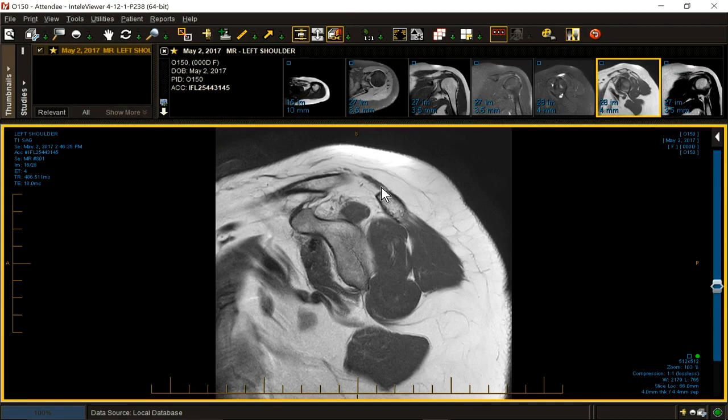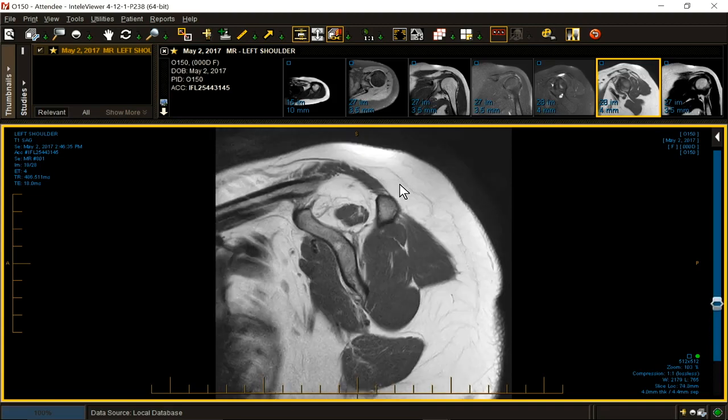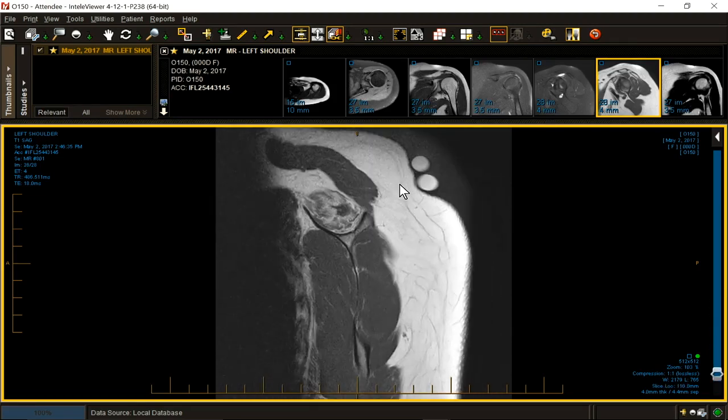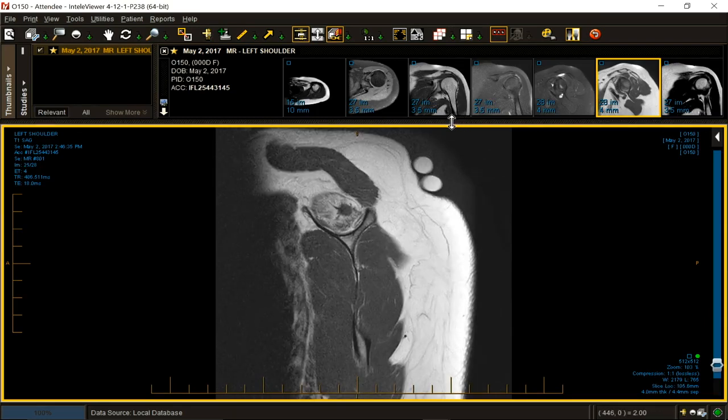Now, there are conditions where you can get painful fatty change around the shoulders. One condition is known as Madelung's disease, the other is known as Dercum's disease. But we stumbled on an interesting finding.